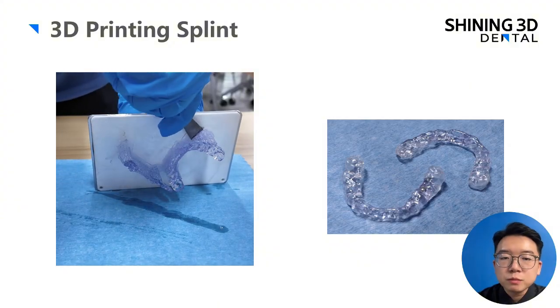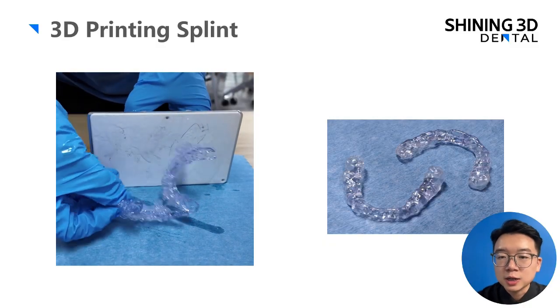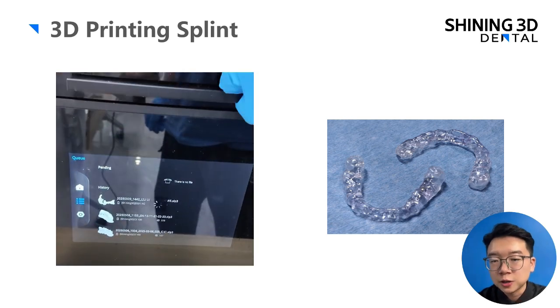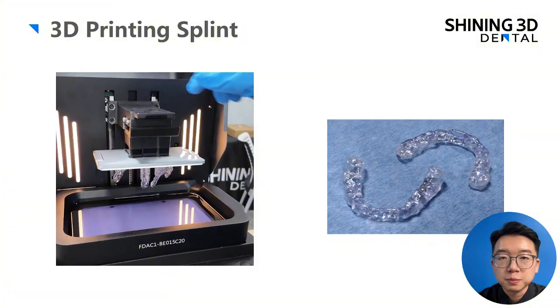And you can see the final result on the right side picture. This is the real splint that we printed out for this patient, and you can see the polished look after the nitrogen curing unit did its job.